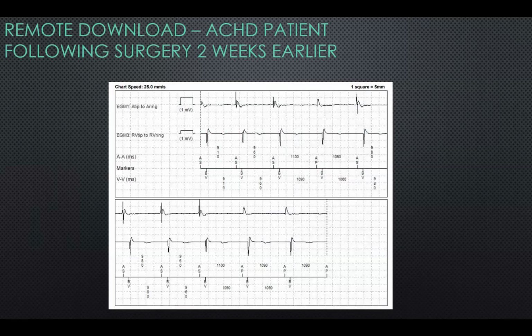Okay, so this is a remote download from an adult congenital patient following surgery. Patient has heart block. This is a download done 2 weeks earlier following surgery.